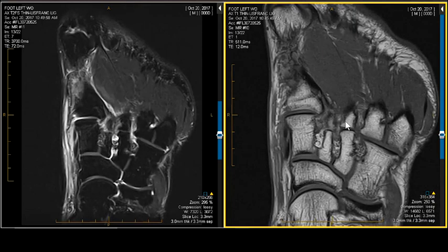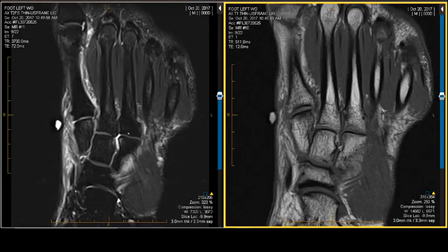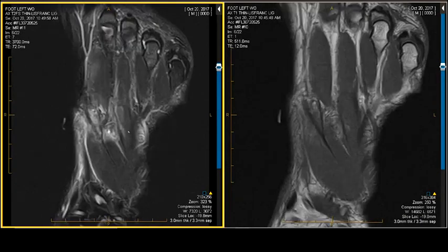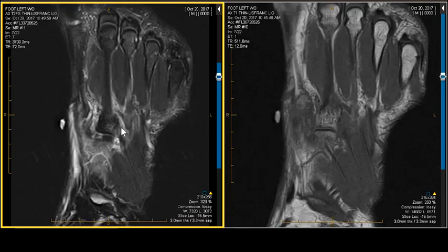You're getting an operation. So I'm going to say plantar ligament complex torn, probably C1M2. C1M3 may be there, right there. Don't care. All right, how about the dorsal one? I don't care, but let's see if we can spot it. Do a little train spotting. And that one is torn.